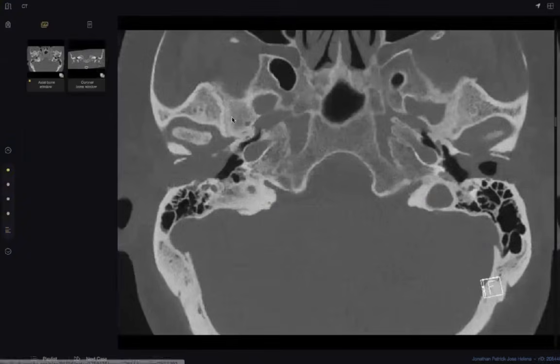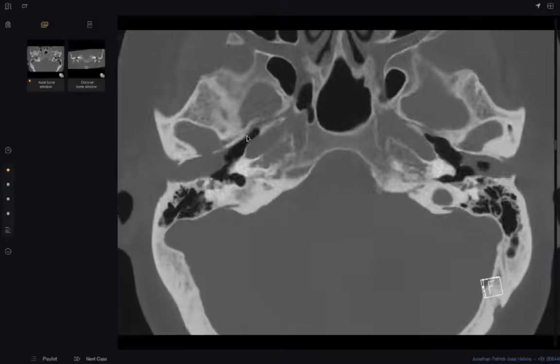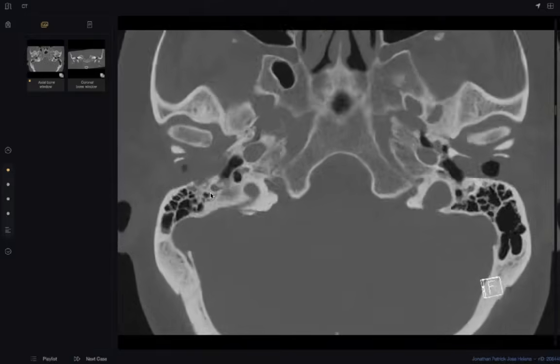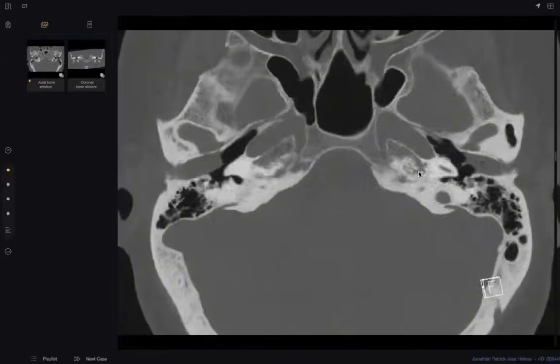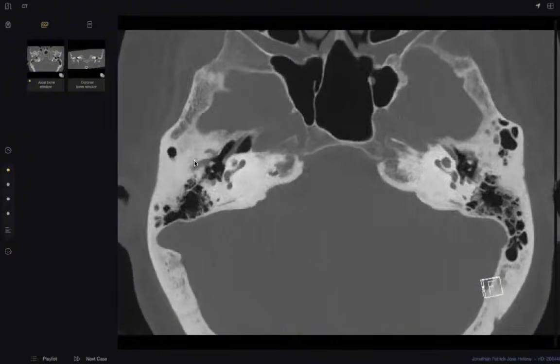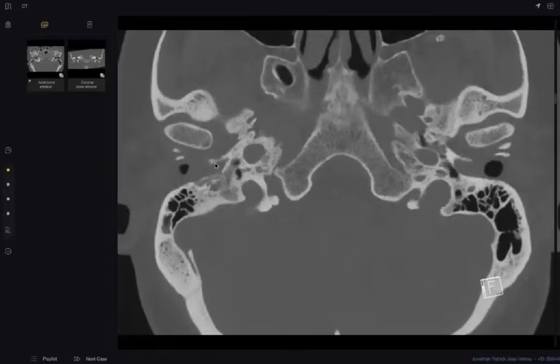What happened? The examiner gave you CT and bone window. Very atypical scenario. When you are looking here, compare. See the bone here, convex, but here eroded. Very important. Okay? And if you follow the external canal here, because it is confusing, in comparing with the other side, you will see something here eroding this bone, and look here, abutting the ossicles. Erosion. The most striking abnormality here is erosion.